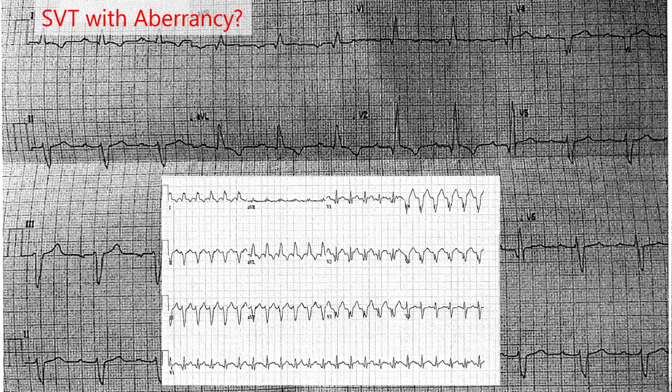So here, if I had to summarize in one sentence what I think is happening, I think that the QRS complex in sinus rhythm looks very similar to the way it does in tachycardia, although there are some variations in the QRS morphology, most notable in the anterior precordial leads in the tachycardia.